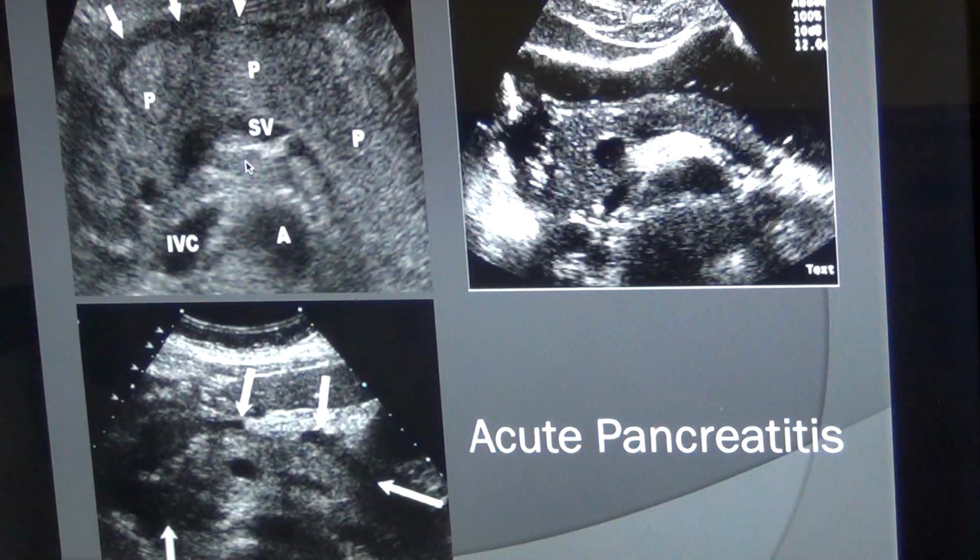And you look, I see the common bile duct is here, dilated, due to some obstruction. And there should be one hole over here, called the gastroduodenal artery, the GDA. The gastroduodenal artery is supposed to be seen over here, maybe this one too.